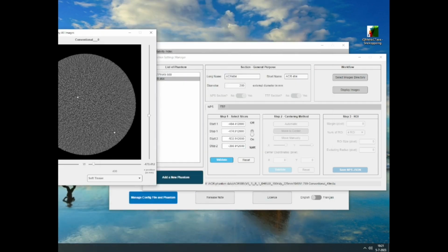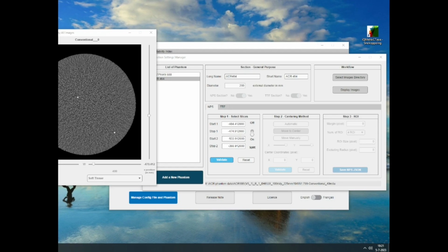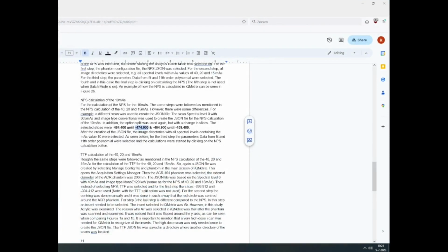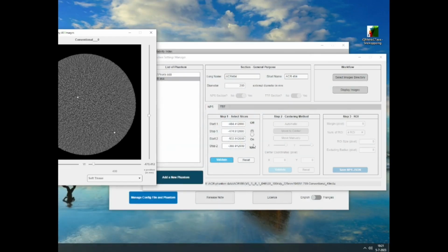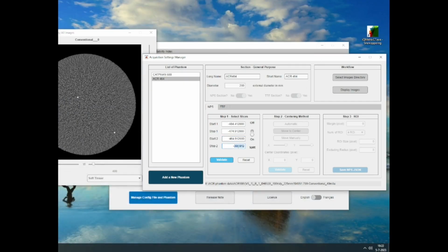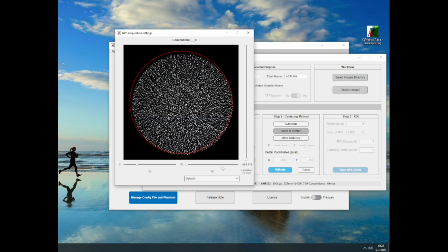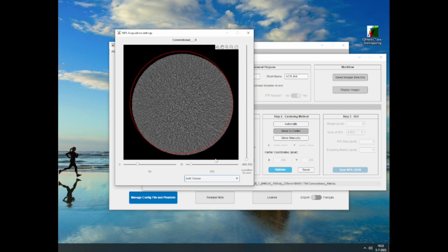All right, so we're going to continue with the analysis. All right, did I select that number? Yes, I did. Then I'm going to use this number, and select this number. After we are done selecting, I believe, right, we can validate it, and this should show again. So this shows again our selection of our slices.